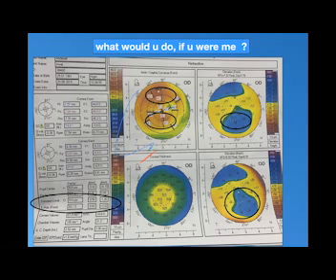The pachymetry: the corneal apex is 523, and the thinnest location is 514. The difference is 9. It's not far. The thinnest location Y coordinate is minus 1.2, but look here, where is the Kmax? So my dear colleagues, we have to correlate the thinnest location with the Kmax. This is an important point I want to see.